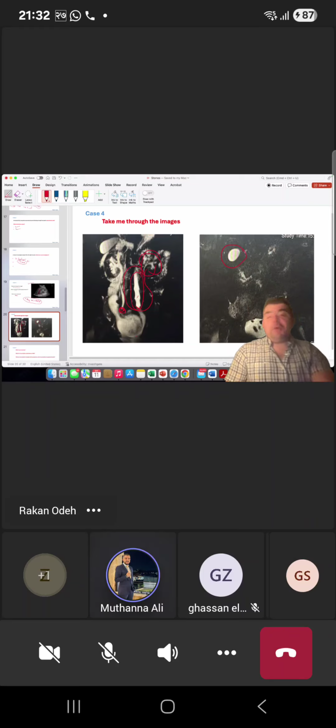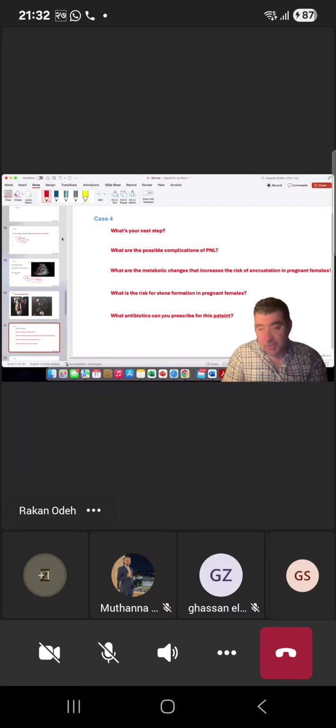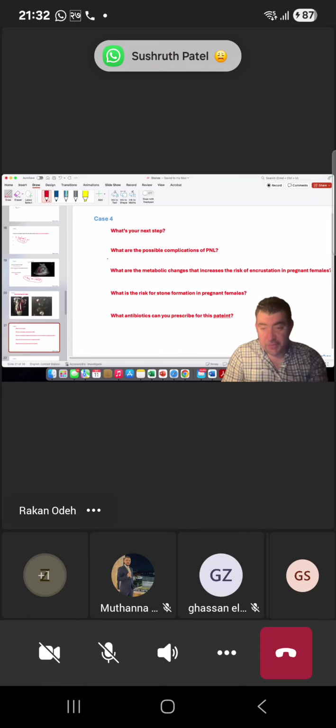So this is a ruptured calyx. Obviously, there's a fluid here, so this is a ruptured calyx. You might be prompted. It's not a big deal because it's difficult. We don't really comment much on MRIs, so even if the examiner prompts you, it's not a big deal really. But since there's a fluid, obviously you need to avoid conservative management, and you need to start the patient on antibiotics, which you did. Complications of PCNL, easy, no problem.